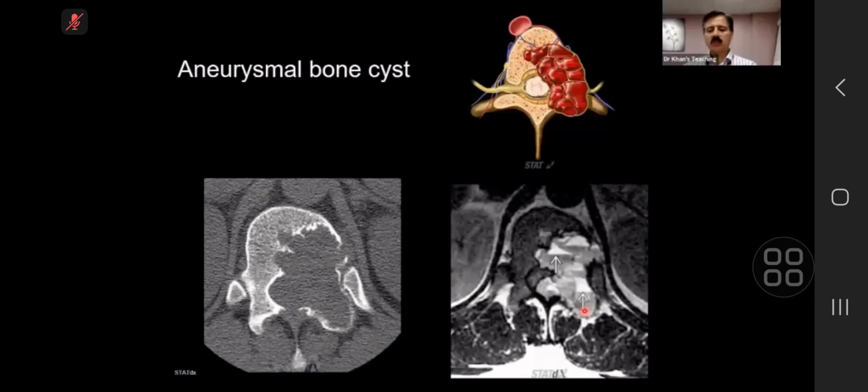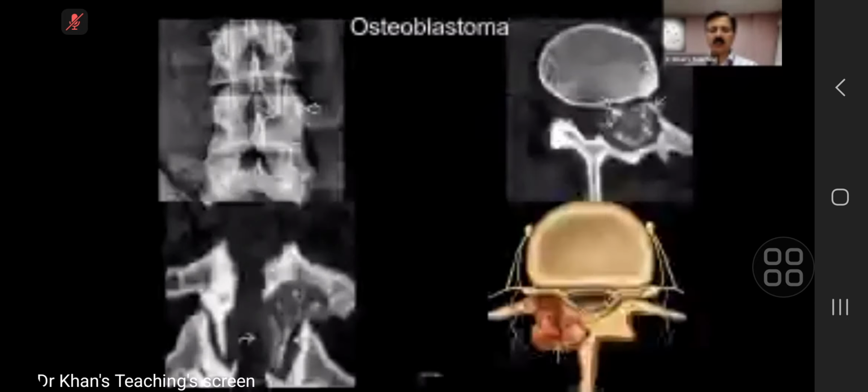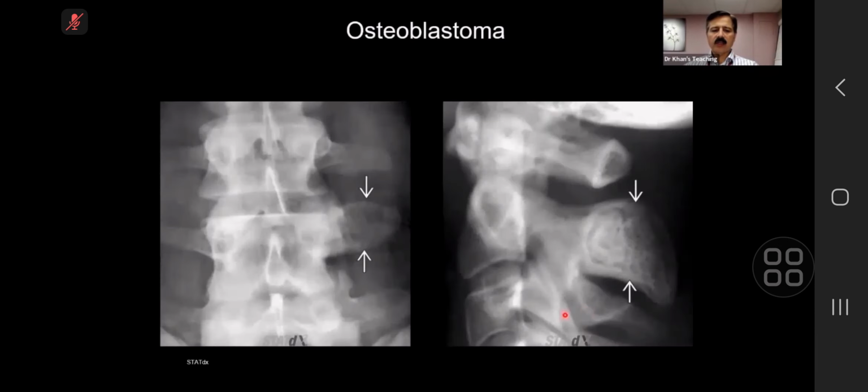Of course, other things like bone matrix and things like that, you can also use, because you remember that pedicle which was thickened, which was sclerotic. So that is another example. Now, in this particular case, this is another example where osteoblastoma is causing expansion of the transverse process.